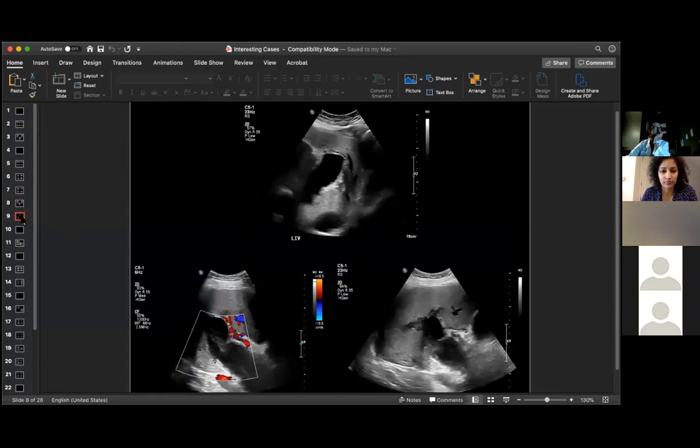We ended up doing an ultrasound the same day. We couldn't sample any normal flow in the portal vasculature, whether in the liver or outside of the liver. And as you would expect, because we could see already that there was cavernous transformation, which tells us it's some sort of long-standing obstructive process. We saw no flow in this structure that is following the path of the portal vasculature. So we were presuming that this was cystic in nature.